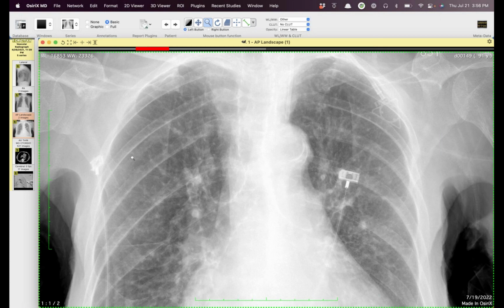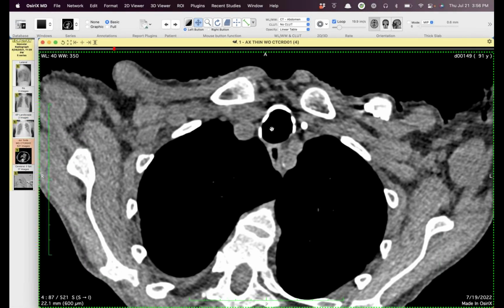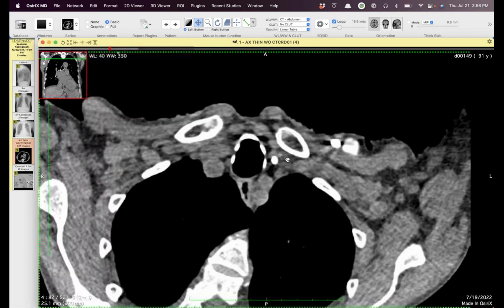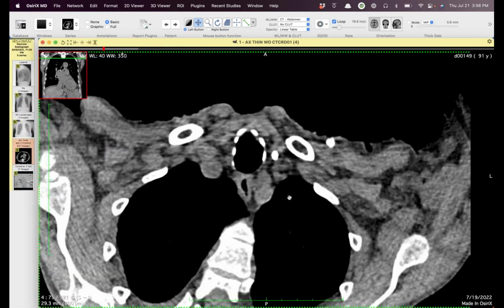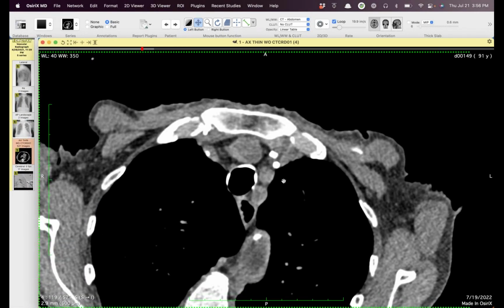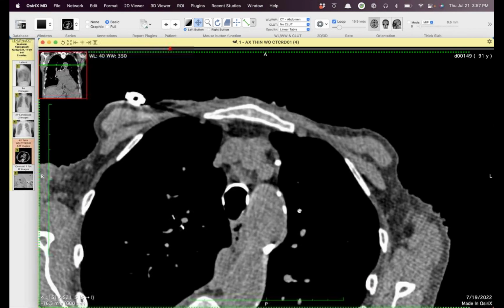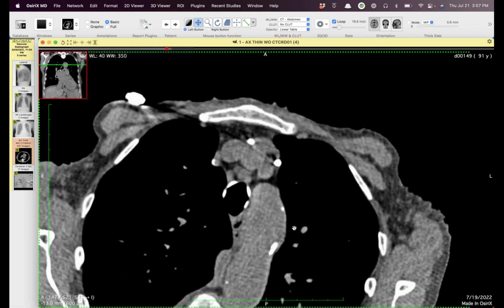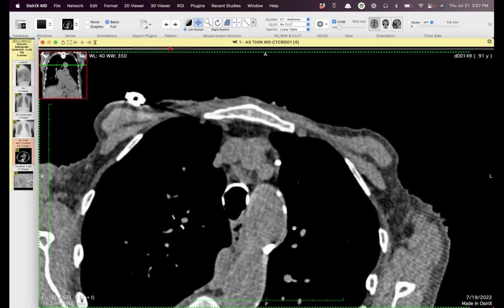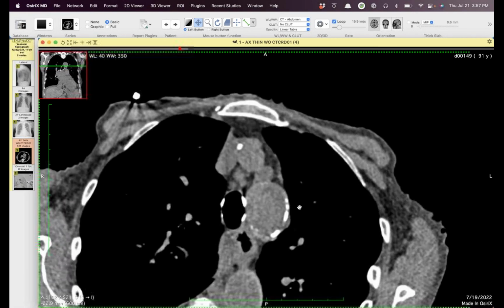And so one of my colleagues suggested a CT for the off chance that maybe it's extravascular, because it doesn't take a slam dunk course. And here you can see the CT was done, and it does go into the internal jugular vein. So it clearly starts out in the vein. And instead of going across, though, and it looks like there's probably old calcified fibrin sheath from an old catheter, instead of going across into the brachiocephalic vein, it just goes straight down. And so the question then becomes, is this extravascular in the mediastinum, or is it in a collateral vein?